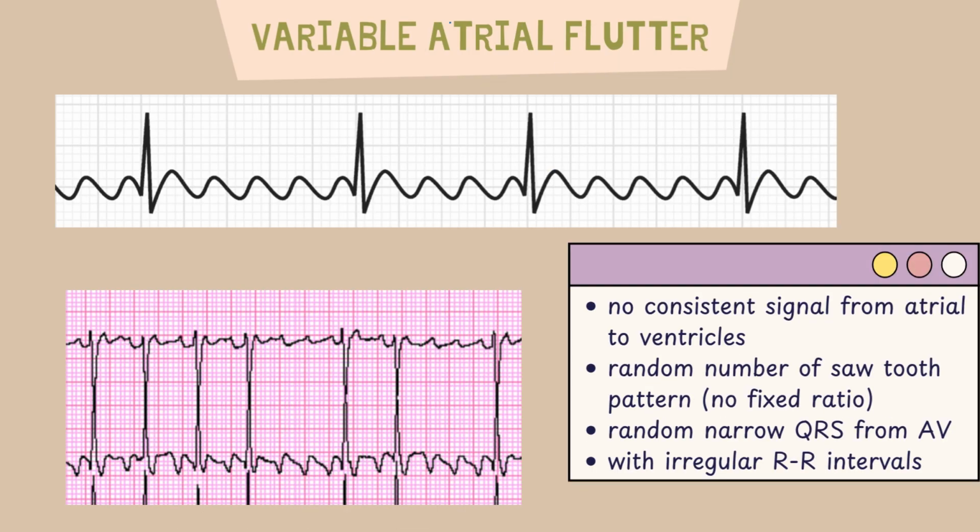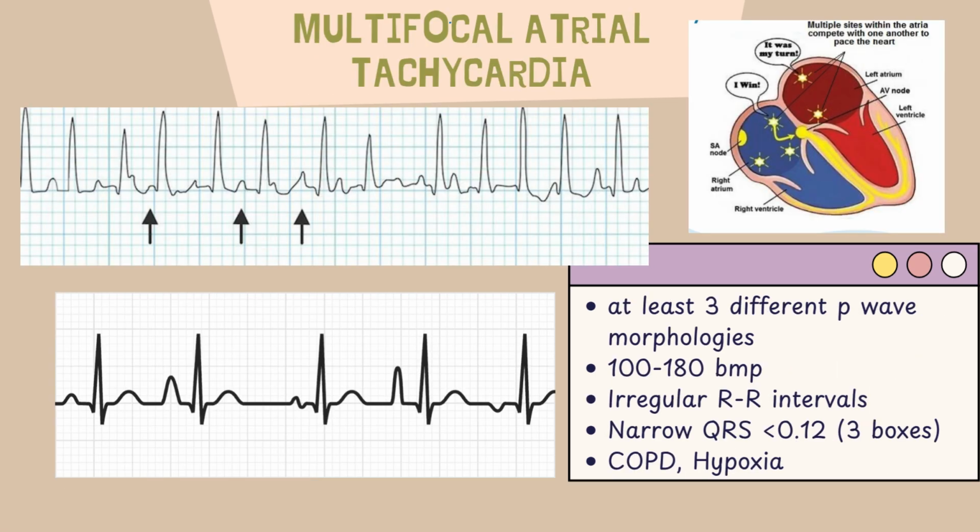As I alluded, our atrial flutter doesn't always behave nicely. Instead of a beautiful 2-to-1 ratio with beautiful saws, sometimes you get variable conduction where the AV node just lets through some beats and skips others, and then you get all this weird looking small flutters looking irregular with an occasional QRS. And now, my favorite, multifocal atrial tachycardia.